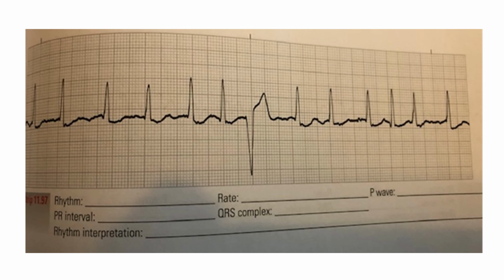So this is atrial fib. The heart rate being that it's 100, we like to say below 100 is rate controlled. And the PVC, it's just one, but again, you would monitor this. If the patient is in AFib, you want to anticoagulate them, consider beta blockers or antiarrhythmics to control the ventricular rate.